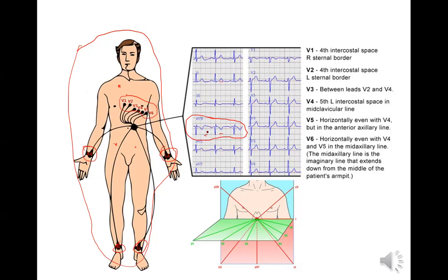So that's true, yeah. So AVR, is it positive or negative? Good. Is that normal? Yeah, that's normal. Everything's going to be normal on this EKG. And then we look at lead 1. Is that positive? It is. Lead AVF. This one might be hard to see. Yeah, it's positive. So that's good. So you have 2 thumbs up, right? Lead 1, positive. Lead AVF, positive. So that's normal axis. So this side, the left side of your viewing screen is your limb leads, your axial leads, looking for axis.